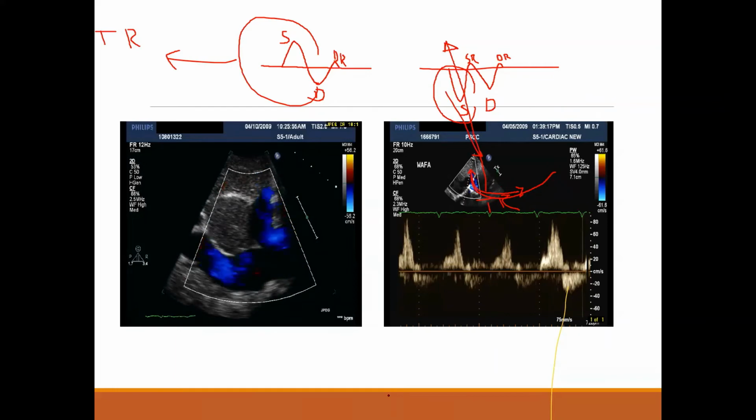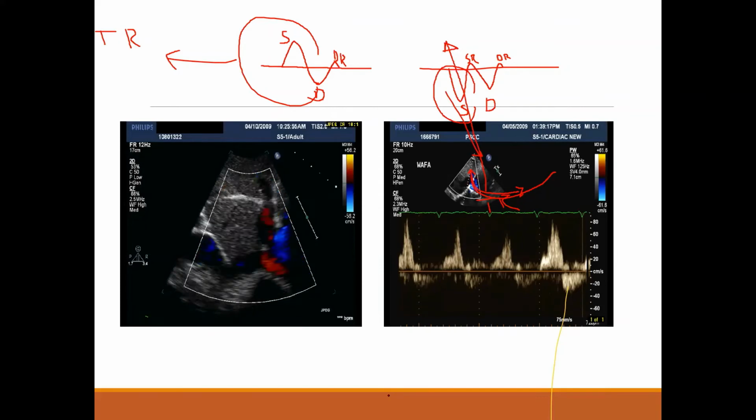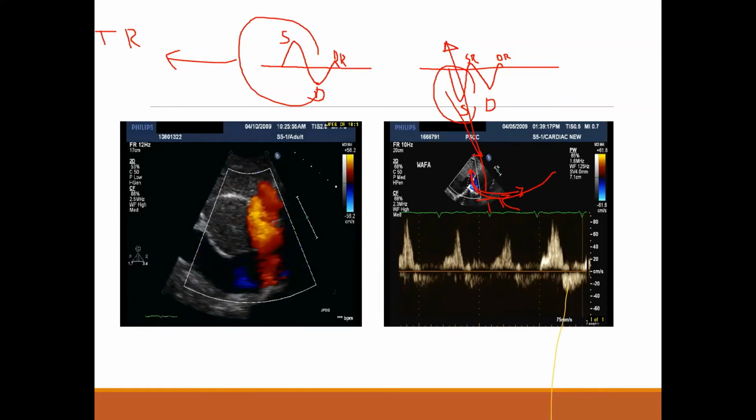And you remember I have spoken about the pulmonary venous reversal in severe mitral regurgitation, and the caveat. The same applies here. If I see this reversal, I'm confident to diagnose severe TR. But if I don't elicit it, that does not rule out severe TR, because it is very specific but not sensitive.